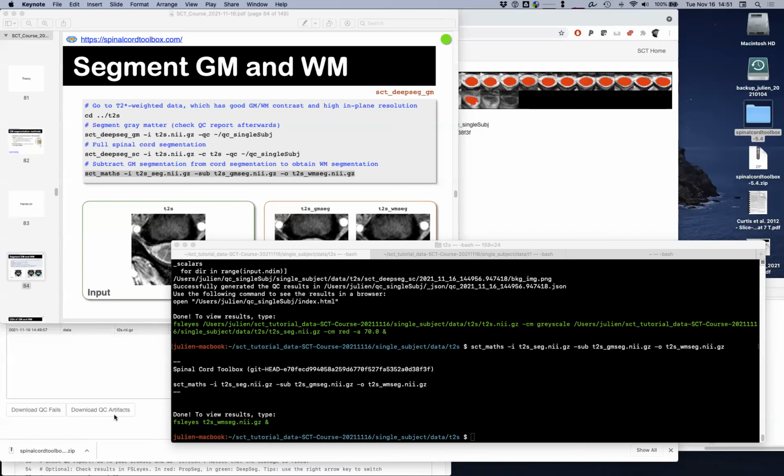The first step is to extract on a slice by slice basis a patch around the spinal cord center line, and this patch is then intensity normalized, histogram normalized, and this helps with the bias that you're describing, which usually runs in the superior-inferior direction. In this case, we do a slice-wise normalization of histogram. So that's our way to mitigate this problem. Great, thank you.